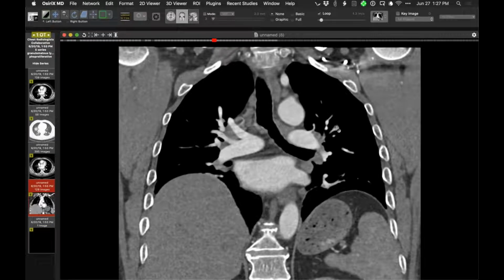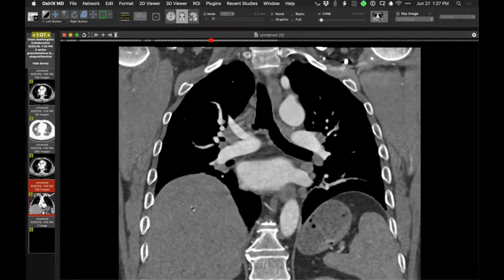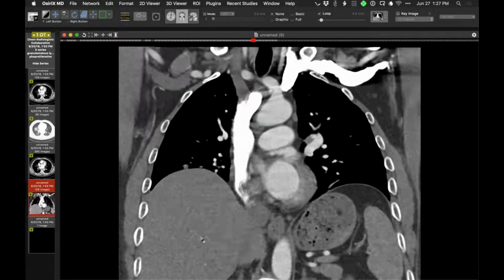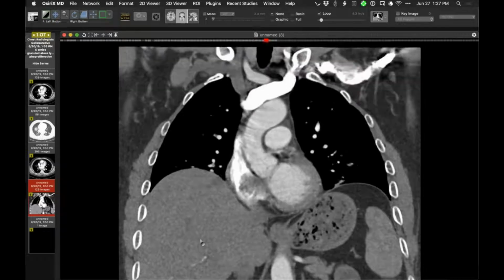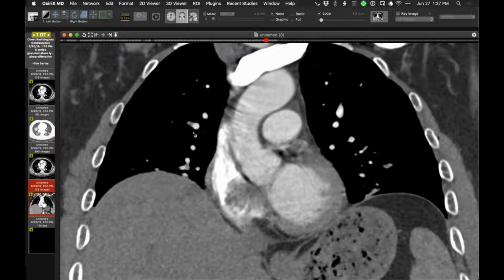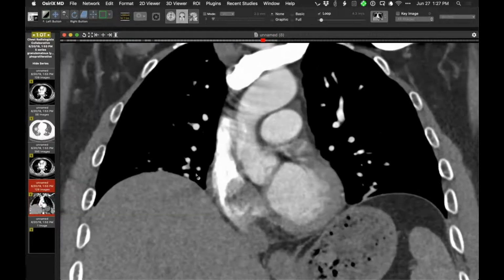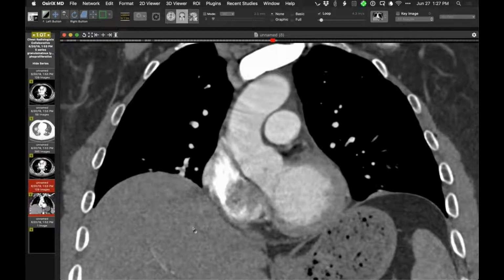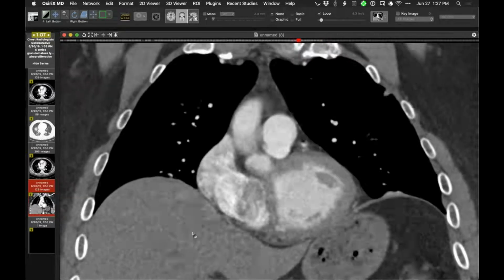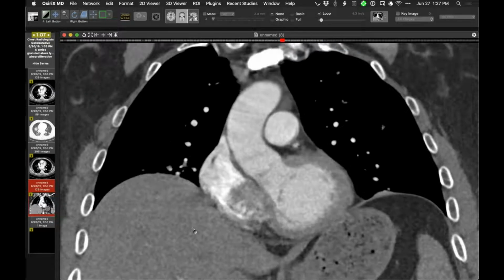So for example, here, right there, and I'll show you a few more, right there. And there are going to be a few more nice ones, like right there. So let me mag that up, right there. And right here. So there are a couple places in which I'm pretty confident we have involvement of intrapulmonary lymphoid tissue near perhaps branch points of bronchovascular bundles, like right there.